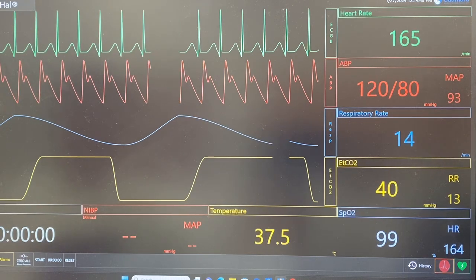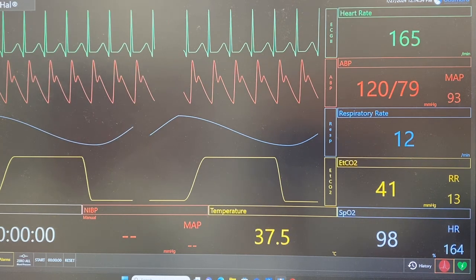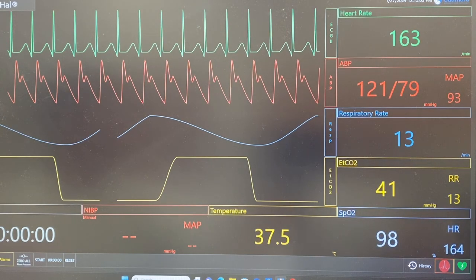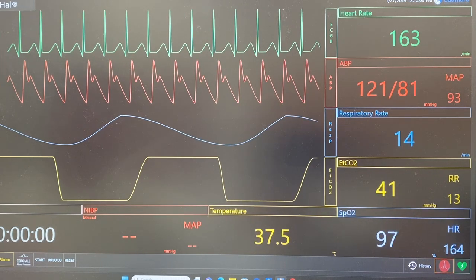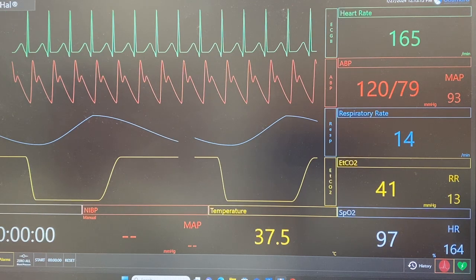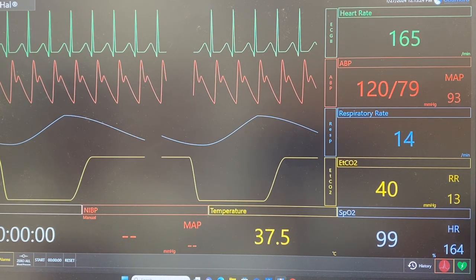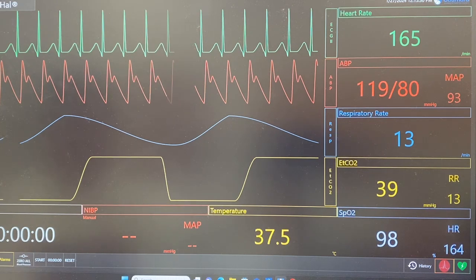Because there's no P wave, what can we not call this rhythm? Atrial. Can we call it sinus? If it's sinus, you would see a P wave. We already said there's no P wave, so it's not sinus, nor is it atrial. Then the next thing to look at: we can skip the P to QRS, and we don't measure the PR interval, because there's no P's.